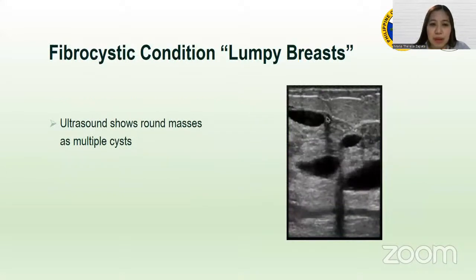This is an example of multiple cysts, or a lumpy breast, in ultrasound. We can see anechoic structures within the breast.